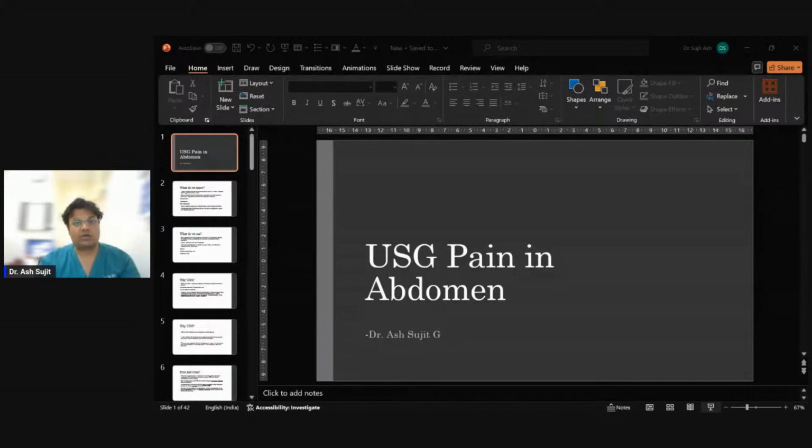But over time, when you do a sonography for these patients, you'll have a cystic mass with homogeneous low-level internal echoes, and that is what we call ground glass appearance. So if you see the powdery appearance in the sonography with not much peripheral vascularity, this is what we call ground glass appearance, which is one of the classical things that you see in endometriosis.